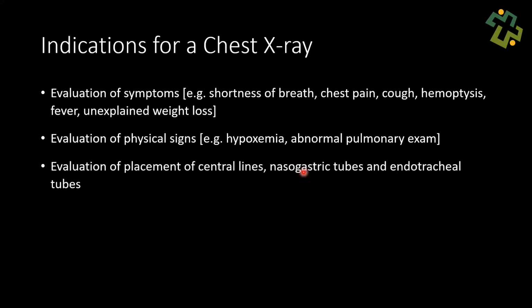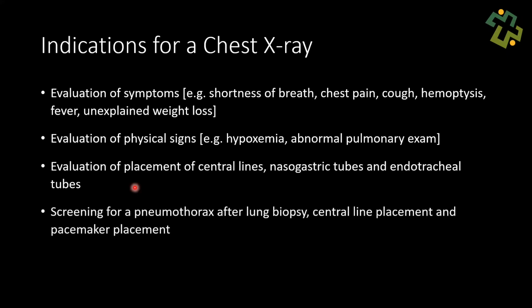And maybe you put in a central line or a nasogastric tube or an endotracheal tube, and you want to check for correct placement of your tube. Maybe you want to screen for a complication, like a pneumothorax after you do a lung biopsy or after you put in a central line or a pacemaker. And then lastly, evaluation of suspected pacemaker lead fracture, another specific indication, but we're going to be looking at some examples of this in lesson number 9.